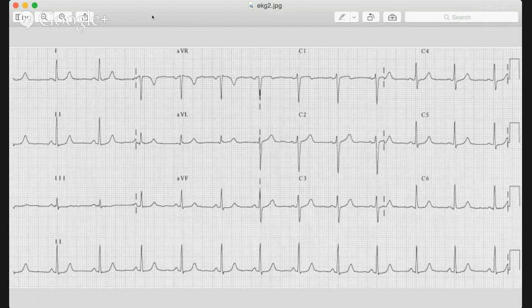And if that is less than 7 total boxes when you add them together, then we are going to assume there's no evidence of left ventricular hypertrophy. Sound good? So in V1, which is going to be C1 on your screen, if you start counting, it's approximately 2.5 to 3 boxes. We'll just keep that in mind. So we'll go higher and say 3.